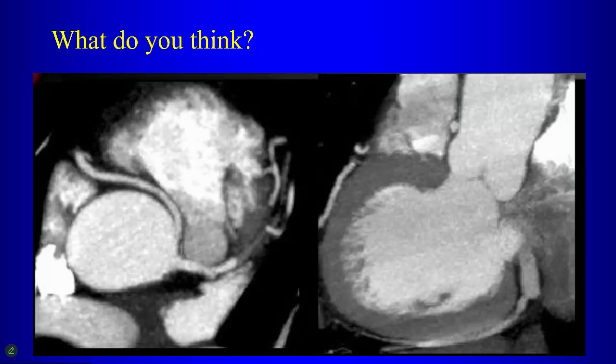Can you see the anomalous vessel there on that view? Do you see it? Yeah, it's right there, between the... This guy here, okay? Right there, there it is. So this guy is the aorta, right? That's the left ventricle, that's the aorta. This guy is the pulmonary artery.